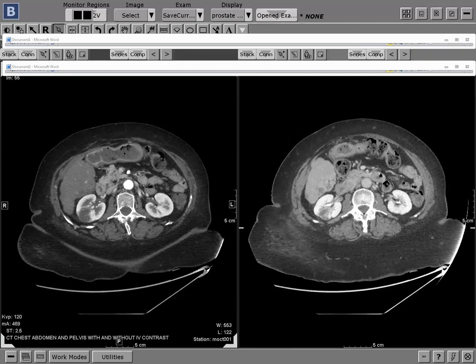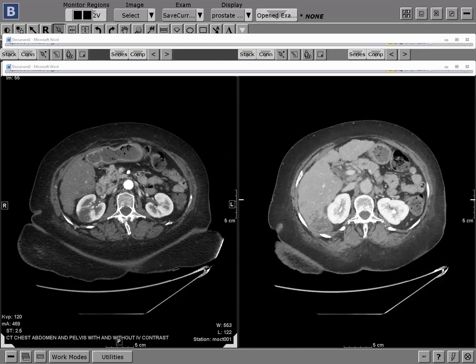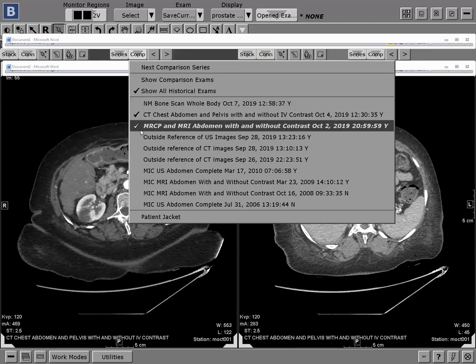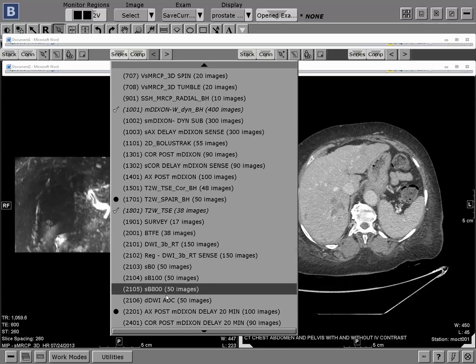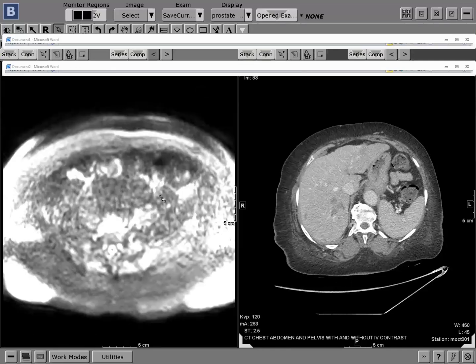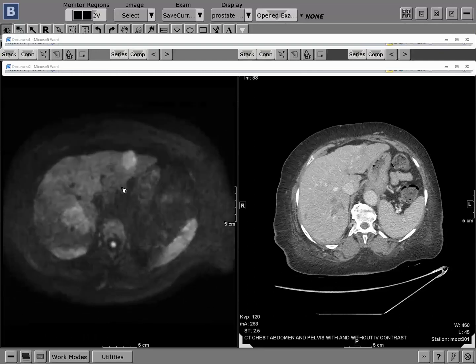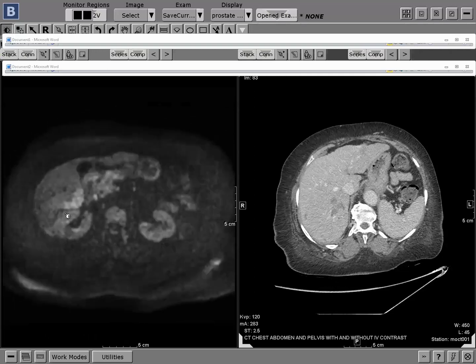So then I went back and said, wait a second, maybe these are infarcts. So when you go back to MR, the kicker here, I think it's very cute, is that when you look at the high B value diffusion weighted sequences, everything is kind of bright, including the HCC, right? So that kind of is concerning, again, for infiltrative tumor.